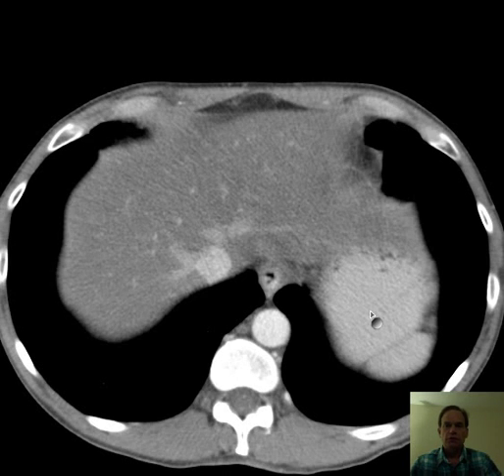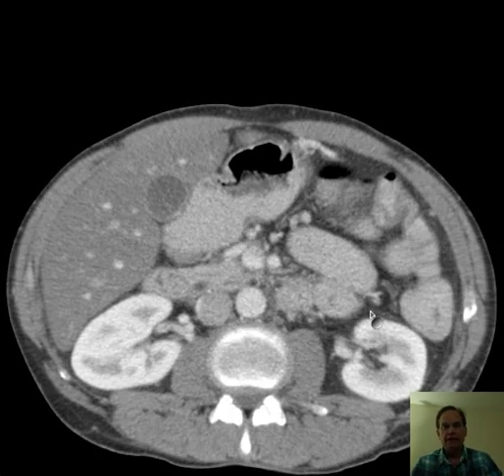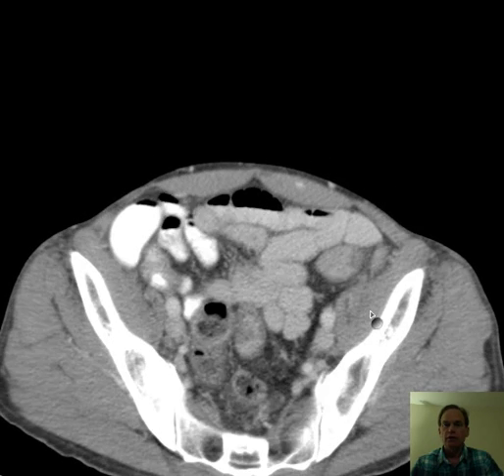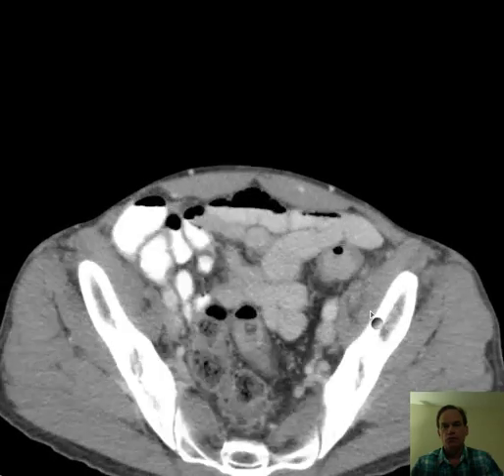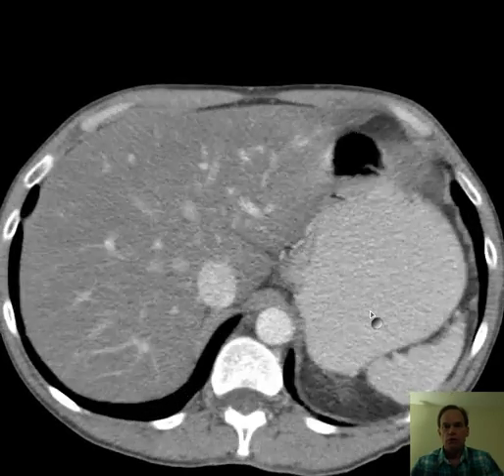This is Dr. Mintz. This is a patient I encountered in the past who has had a history of Crohn's disease and came in with lower abdominal pain. I'll give you a chance just to peruse this from top to bottom, and we'll go over a few points.